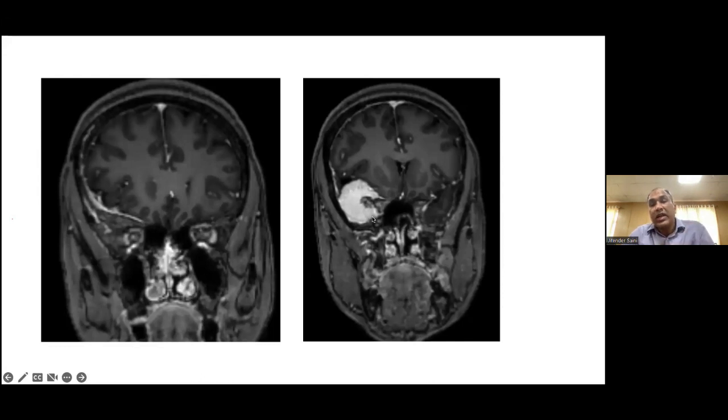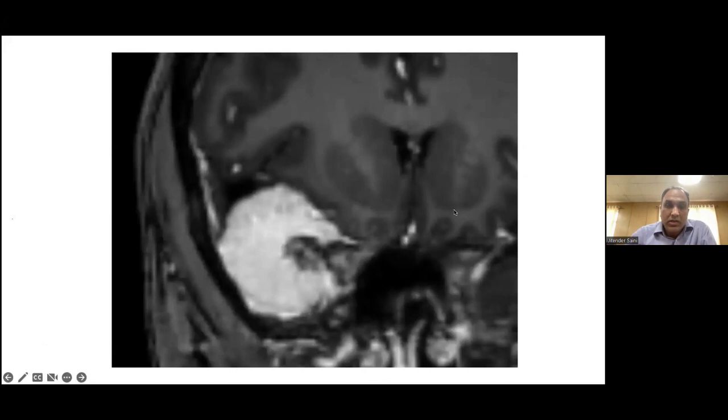The lesion is lying outside the brain parenchyma, meaning it is either coming from the dura or coming from the cranial vault, not from the brain parenchyma per se. So that is an important discrimination here. You can see in the zoomed view, this is the lesion, this is the CSF cleft, and the brain is pushed here. Can you see? And there's gray matter coming here, which is just adjacent to the lesion. The lesion is strongly enhancing, and the adjacent dura is thickened here. You can see this one. Correct? So this gives us a clue.